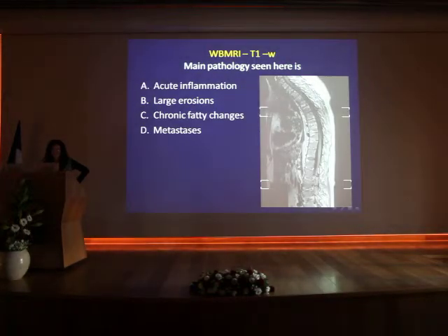Let's go on. What do you think what we see here means? What are these changes? Are they signs of acute inflammation? Are they signs of erosions? Are they just chronic fatty changes? Or are these metastases?